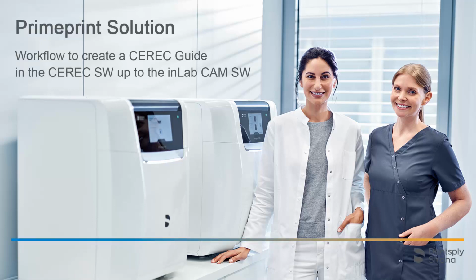Welcome to this video tutorial on the topic of Primeprint Solution. This video demonstrates the workflow to create a CEREC guide. We will run through the CEREC software up to the in-lab CAM software.